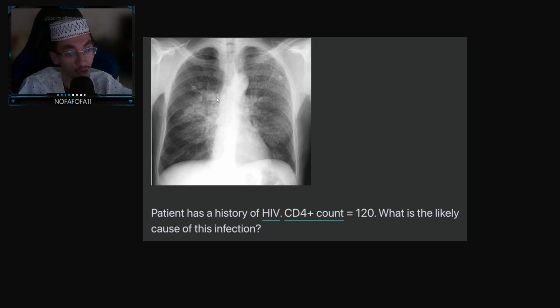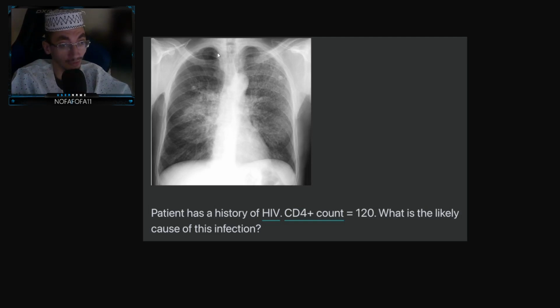But I want you to know that perihilar, meaning very close to the hilum, there is a widening. There is an enhancement of the lungs' interstitium towards this region. And on the left side, again the same issue. Specifically, in this entire region, there is enhancement of the lungs' interstitium.